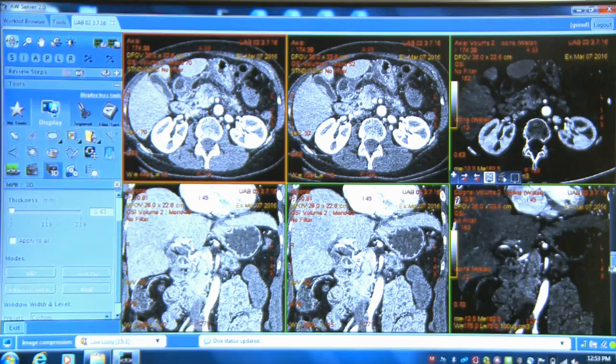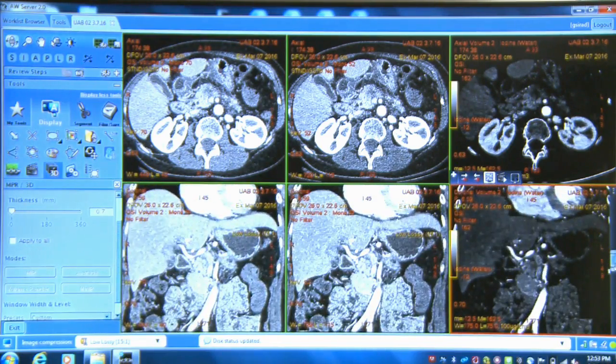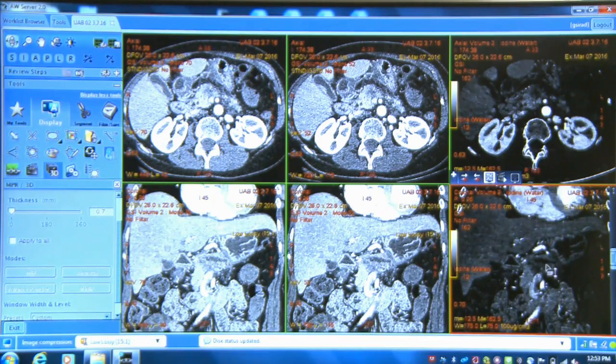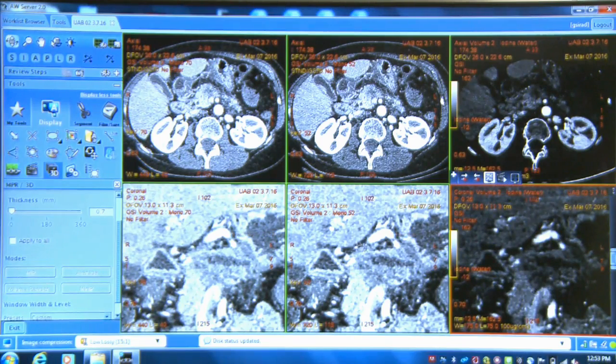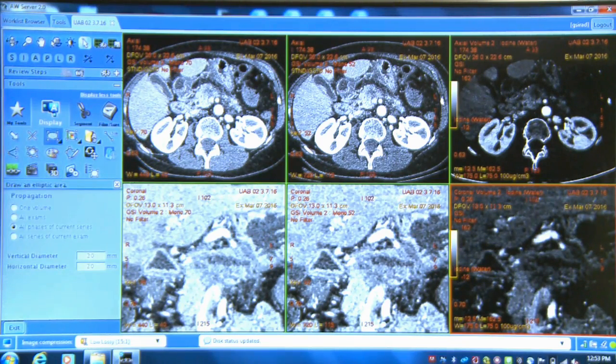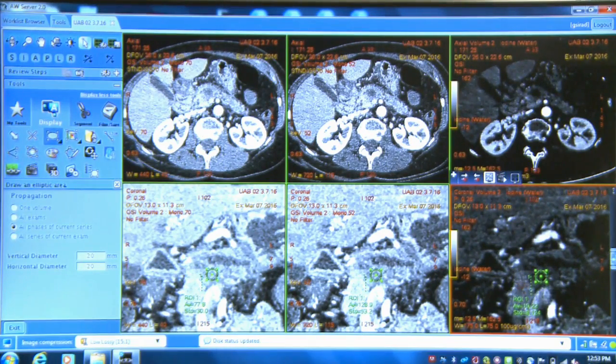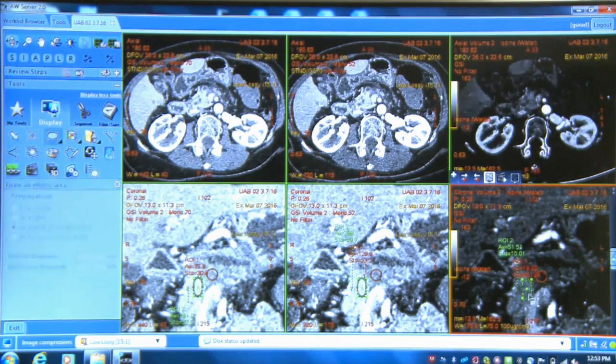An easy way to look at this particular patient's tumor is coronally, and if we get to the right image level, we can see the duct, the tumor, and the normal pancreas. I'm going to make it just a little bit bigger to drop some regions of interest in. Again, it's one click. We can come across. Here's the tumoral Hounsfield units. This is non-tumoral.